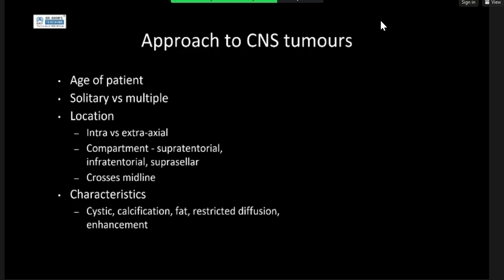And as you know, your extraaxial signs include having some cortical gray matter between the mass and the white matter. You've got a broad dural base, which displaces and expands the subarachnoid space. And you can also have what we call a CSF cleft, which is a thin rim of CSF between the tumor and the brain parenchyma, and of course some displacement of the subarachnoid vessels. So things that we already know, but it's just a little bit of a refresher.